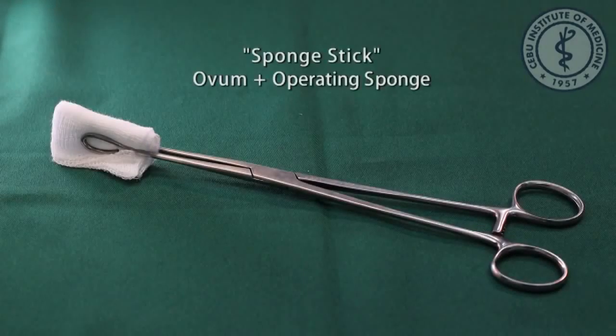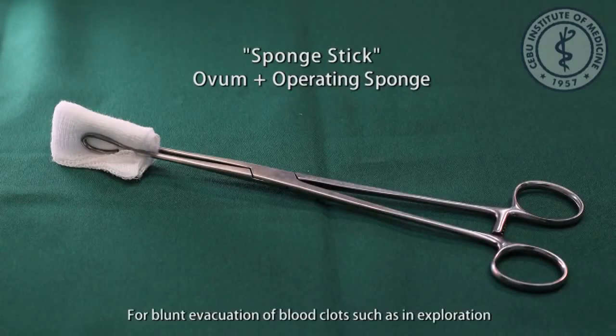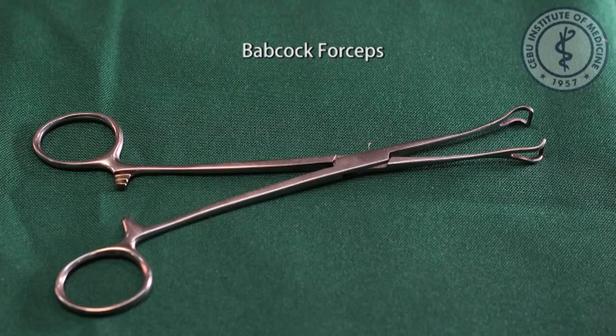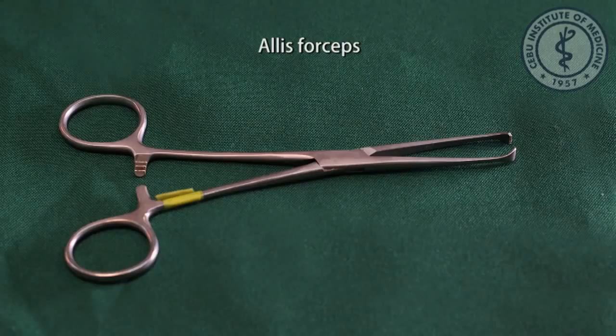Ovum forceps, sponge stick, ovum forceps plus operating sponge, for blunt evacuation of blood clots such as in exploration. Mixter forceps, peanut pusher, Mixter or Kelly plus operating sponge ball, for blunt dissection. Babcock forceps, for grasping hollow or visceral tissue. Allis forceps for grasping connective tissue.